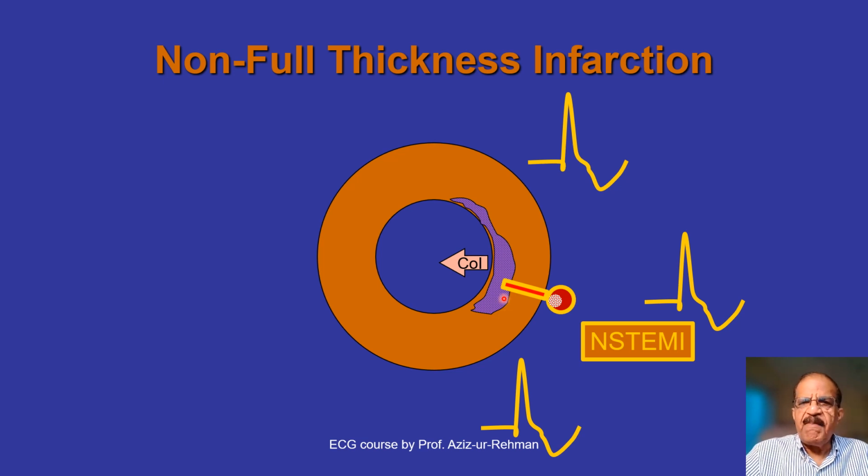So this was the background, and now we are going to take up just 3 or 4 ECGs and going to observe them in detail. And this is the kind of exercise, and I think that will help you to understand and memorize how to make a diagnosis of anteroseptal myocardial infarction.